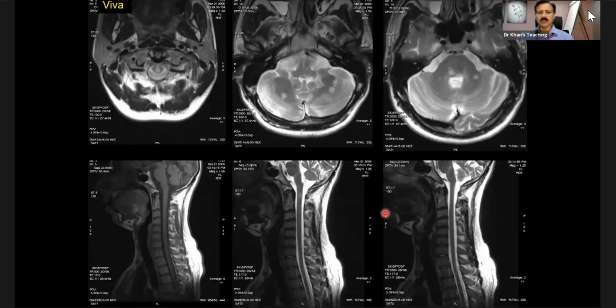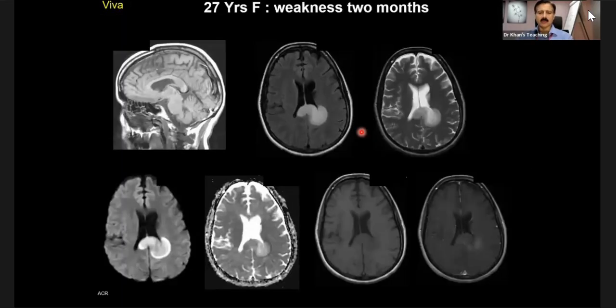So this case of MS has got, and this can start. Please remember that 10% of patients with MS present with cord lesions, and it is taken as a bad prognostic sign. In the exam, when you see something in the spine, always look at the brain. And if brain is not provided, you tell the examiner, I want to look at the brain. They want you to say that. Remember this. In this particular case, there are lesions there. So already we have got 2 out of the 5, right? Dissemination in space. And then you can ask for contrast. You can ask for the rest of the features to diagnose MS.